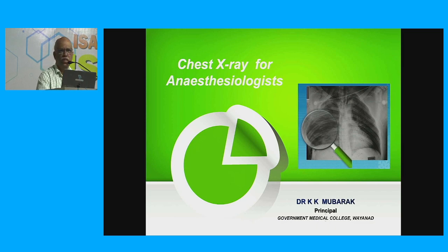Okay, Medical College Kottayam, just put up your hands. Please tell me which are the common views of chest X-ray. Commonest view of chest X-ray taken is? PA view. Why do you take a PA view commonly? Scapulae are away from the lung fields, so the lung fields can be more visible, and the heart shadow doesn't look bigger.